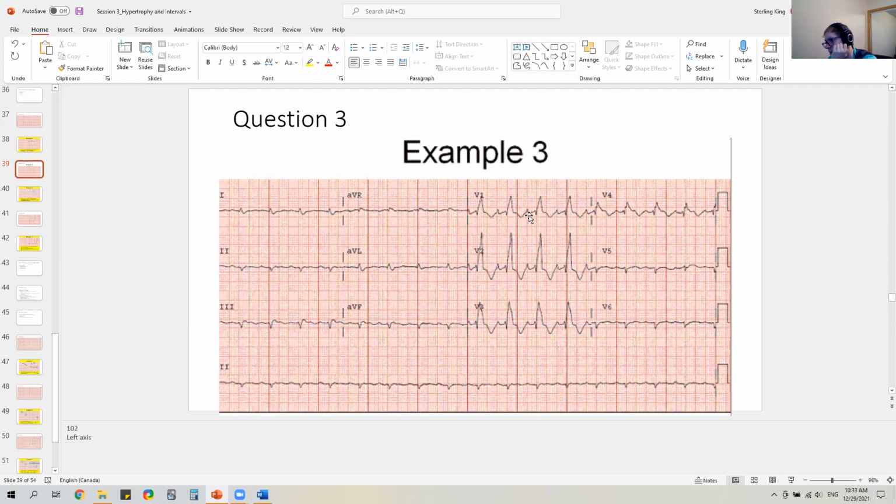Rhythm. This rhythm is a little bit more obvious over here. So I see P, like this looks like the T inverted, P, Q, R, P, Q, R. Yeah, so there's definitely P waves first. So looks like sinus, well, maybe a sinus tachycardia. Intervals, it looks about like a normal interval. Maybe a touch close to long, but it looks like within the box. I'm going to say normal PR.